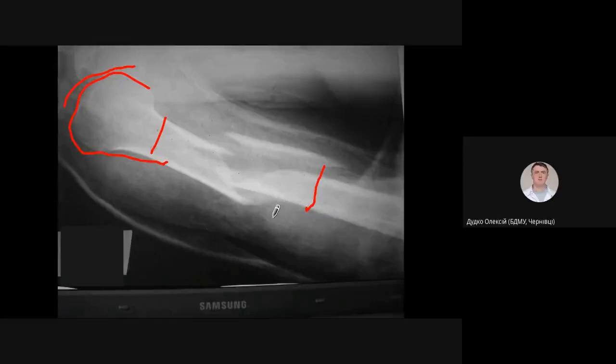with some displacement. Here we may note that there is some displacement of the distal part, but actually it's not significant, with some shift to the medial side and some small angulation of a few degrees. So this position of fracture fragments can be considered as acceptable. As well, we can see the contour of a plaster bandage around the humerus, which means that this patient is treated in a plaster bandage with non-surgical management.